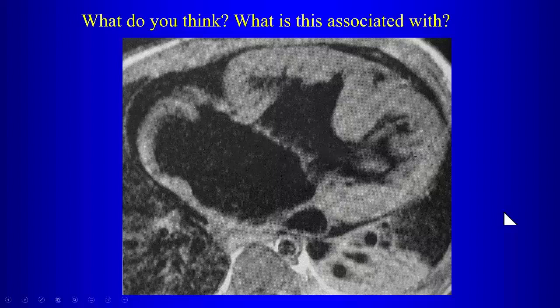Well, notice that you have all four chambers communicating there in the middle of the heart, right? And then you have this one large common bridging valve that seems to be going across the middle of the heart. So this represents what? Remember, embryologically, what contributes to formation of the interventricular septum and interatrial septum in this region? Endocardial cushion. So what are we looking at? This is a complete endocardial cushion defect. So you're looking at a complete endocardial cushion defect here.